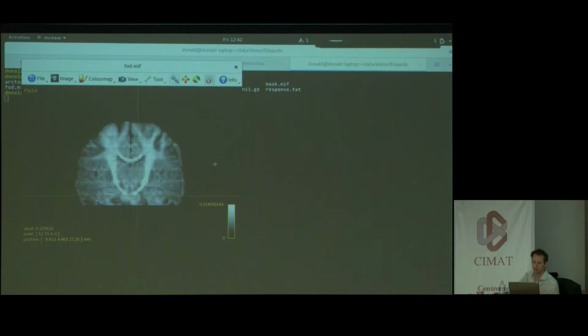So I'd recommend that. Now the problem is, if you do a tensor fit, you might think, well, we're fine because we're normalizing to the b0, which has exactly the same artifact. But that only applies if you haven't done any regridding. And the minute you push it through eddy, it'll regrid. So all this bleeding will kind of affect the whole lot. So you do have to worry about it. If you can fix it, fix it.